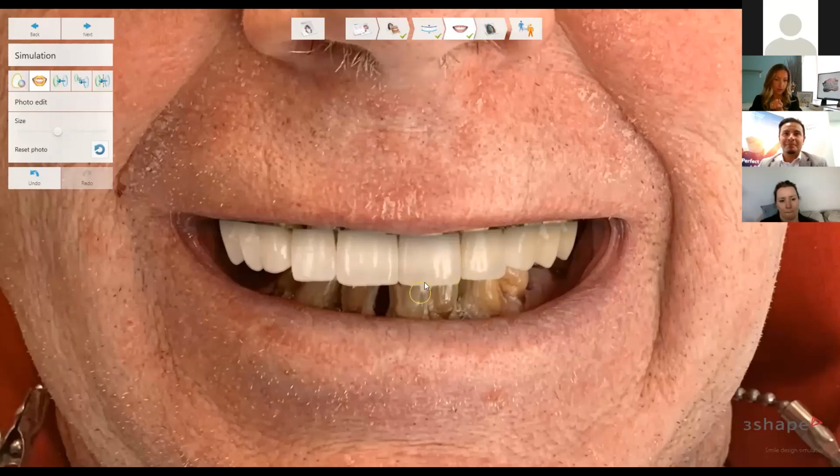So just crisping up these margins here. You can also sort of work in this area. These three copy icons up here, I don't really use them too much, but you can reduce the size of them and you can clean up the areas in here. I don't really use it too much. So this is where the magic happens.